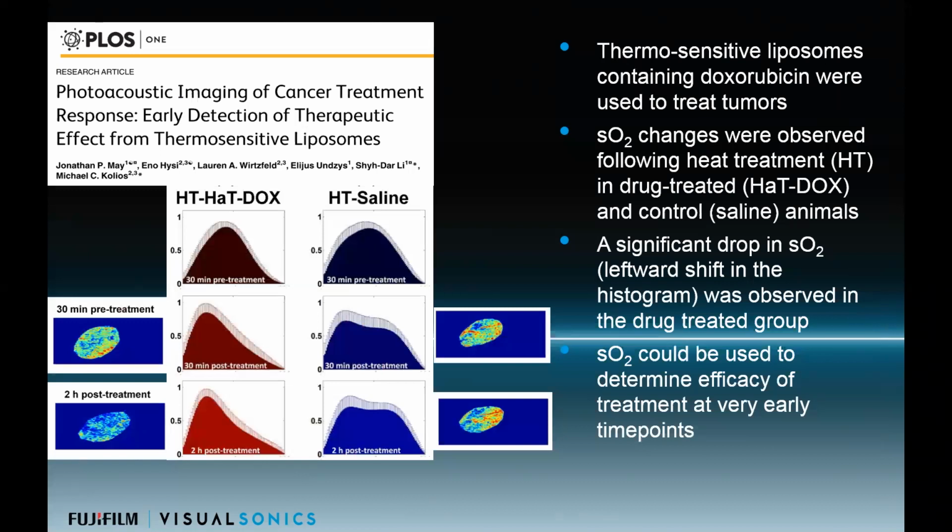And pull out some more subtle differences between some of the treatments that they were doing, showing that some effects of the treatment versus the controls, they could really only see by looking at the histogram of some of these SO2 measurements. So this is just a neat use of the stats that you get from the histograms. So we've incorporated that into the software.